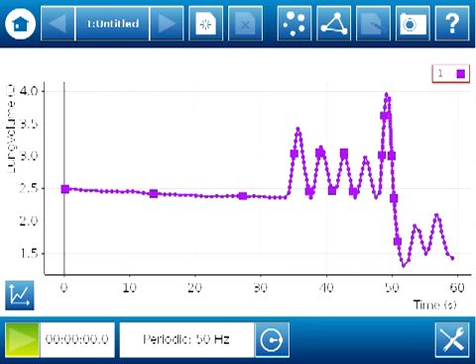In this video, we'll focus on using the built-in tools of SPARKvue software to analyze data related to changes in lung volume. In part 1, I collected data under two conditions: normal breathing and maximum inhalation followed by forced exhalation. We'll use that data to find tidal volume, vital capacity, and forced expiratory volume in 1 second. Let's revisit the graph of lung volume versus time from part 1.